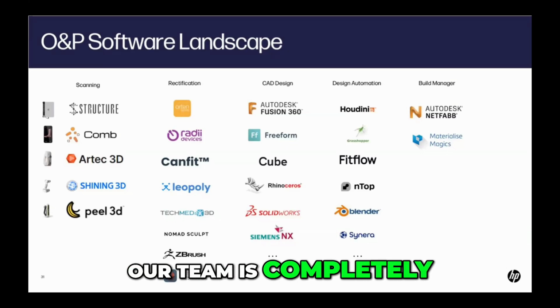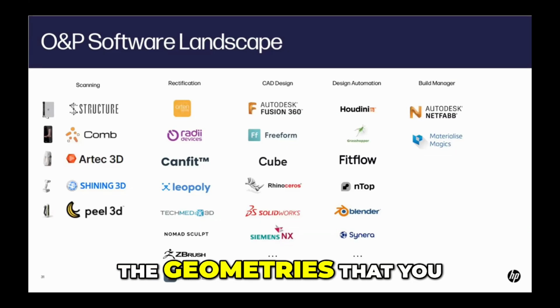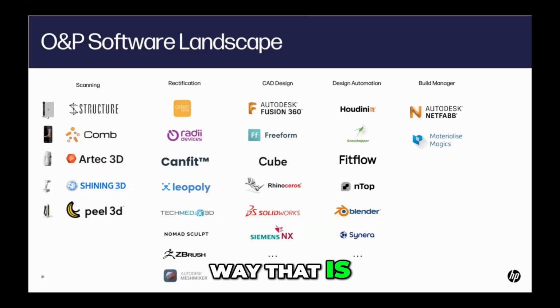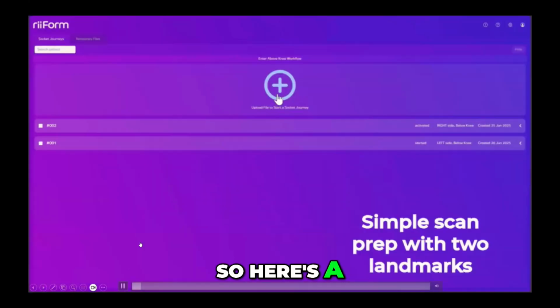Ultimately, our team is completely focused on this design automation standpoint. We can create all of the geometries that you do in traditional CAD, but in a way that is completely robust for new incoming patients and adaptable. Okay, so here's an implementation.